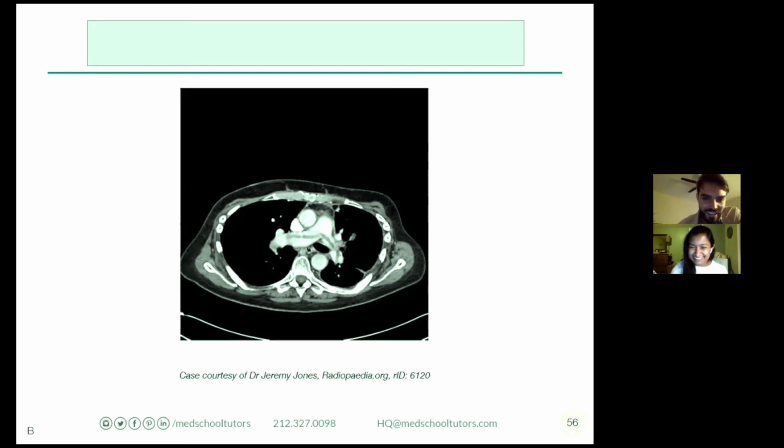All right. So if we want to orient ourselves here, we can find our vertebra, and then just anterior and left of that, or right on our image, is our descending aorta. In front of this kind of bifurcating vessel, we have our ascending aorta, and then this bifurcation here is our pulmonary vessels. And as you so astutely found, this area here is a saddle embolus.